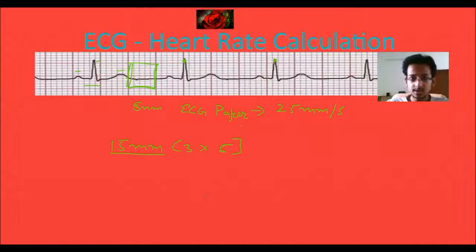It is actually the derivation of how the heart rate is derived from the ECG paper. We are taking 15 mm. Also, with this method, you can even take a 1 mm slot, that is 16 mm. In normal reading we can't take 16 mm, so it won't be so accurate, but in this method you can take any precision. For example, I am taking now for sake only 15 mm.